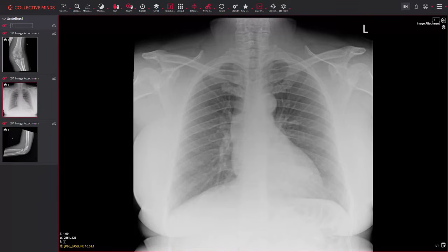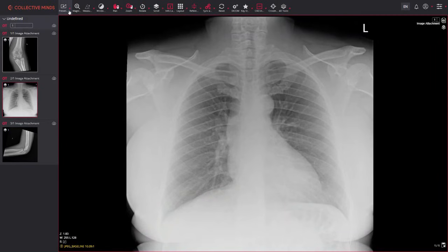Is there a marker? Again, zoom on that. There's not one added at the time of exposure again, which is a shame. Check for whether this image has been taken PA or AP. That should be labelled. Anything outside of the norm, which would be a PA, should be labelled, whether it's supine, whether it's AP, whether it's semi-erect. What we're aiming for is PA so that it reduces magnification of the heart, which you guys obviously already know. But this hasn't been labelled, which suggests that this is a PA study.